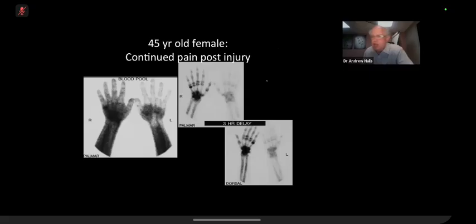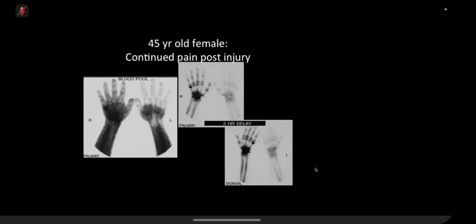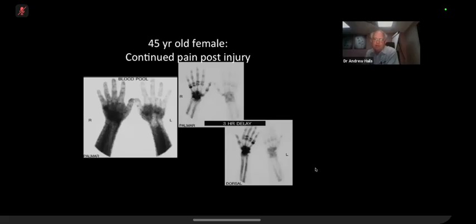post with a neurological abnormality, or an MI. You've got increased blood flow, increased blood pool, and increased uptake on the delayed bone phase images. So I think this reflects sympathetic dystrophy. That's right, yeah. Otherwise, I think these days there's complex regional pain syndrome.